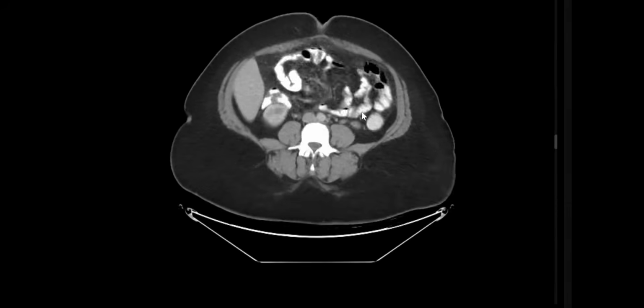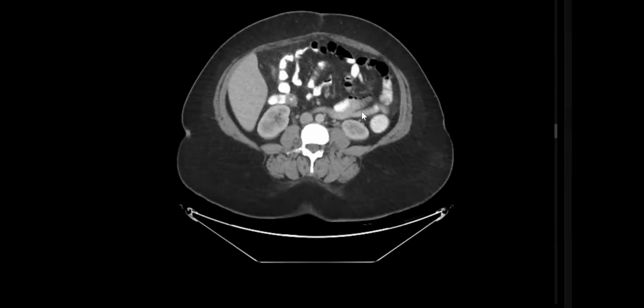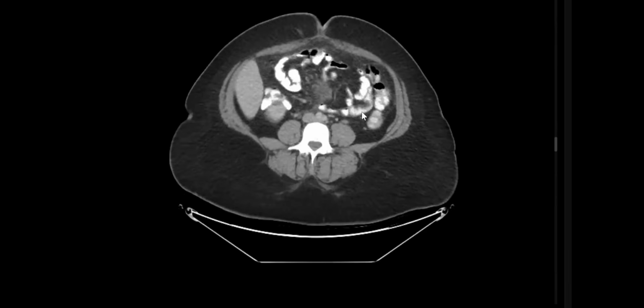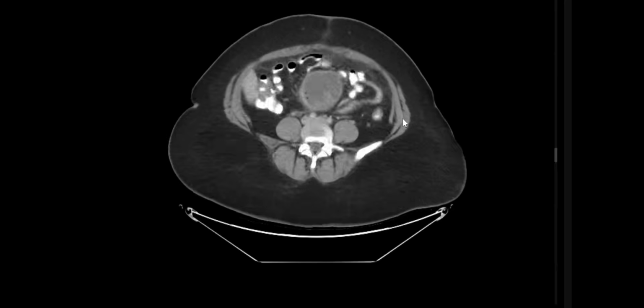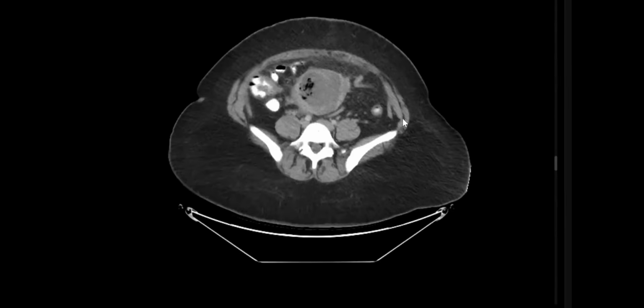I'm trying to look if it is acceptable to see air foci post-cesarean? Yes, sir, because it is post-operative. For how long? For the first 1 week, I think, sir. Yes. Okay. Good. Not acceptable to see this amount of fluid or air after 2 weeks.